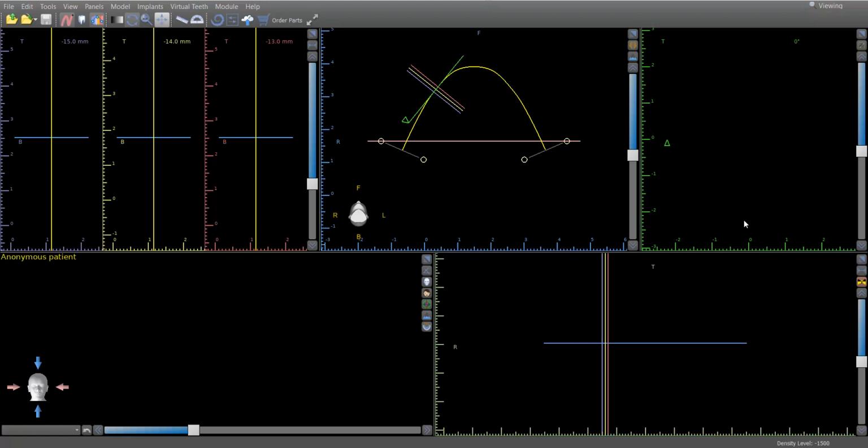So in this series of videos, I'm going to walk you through the very basics of the Blue Sky Plan guided surgery software. And in most of my videos, I refer to it as Blue Sky Plan Guide. So I want to walk through everything from the very beginning through the end, including going over some of these menus up top.